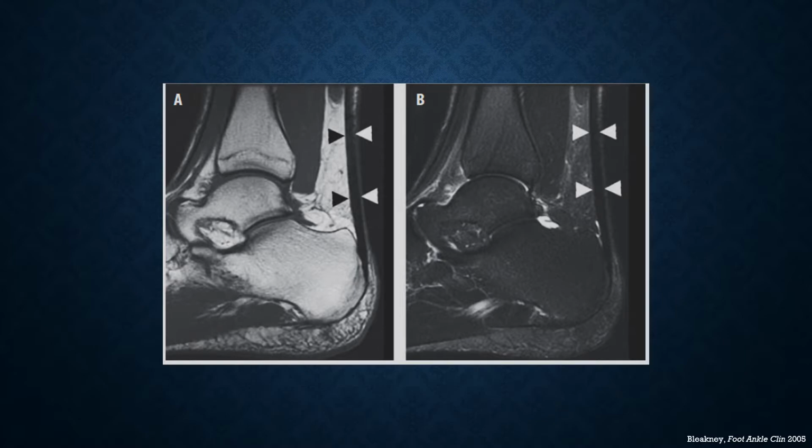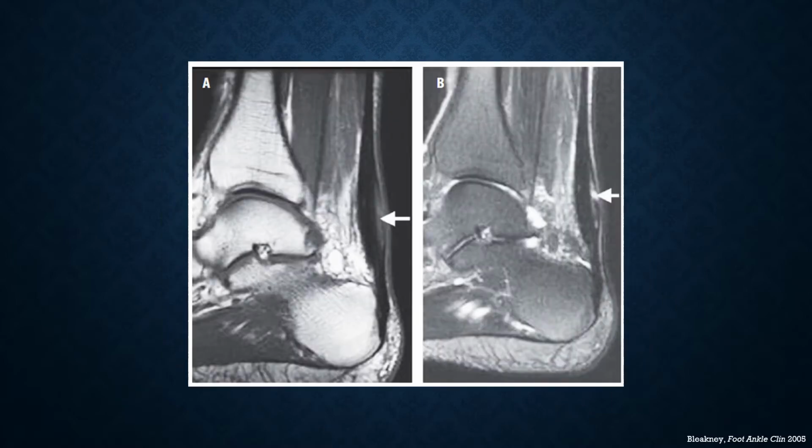Let's transition now to investigation of the Achilles tendon using MRI. Here we can see a normal Achilles tendon using both a T1 on the left and a T2 weighted MRI on the right. Note how smooth and parallel the tendon fibers appear here in a normal Achilles. Here we can see two MR images of a patient with Achilles tendinopathy. Notice how the arrows are pointing to thickened regions within the tendon. Again, we can appreciate the increase in tendon cross-sectional area indicative of tendinopathy. Also, observe the brightened signal in the right T2 image, likely indicative of a mild inflammatory response within the tendon fibers.